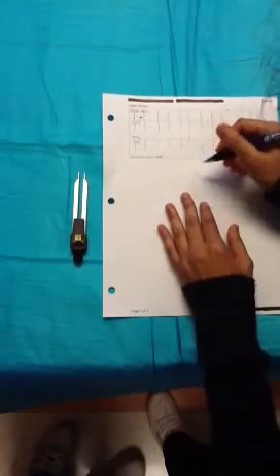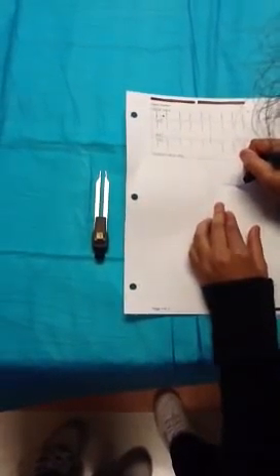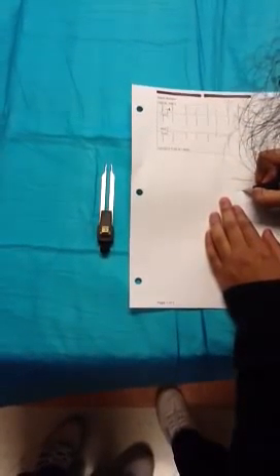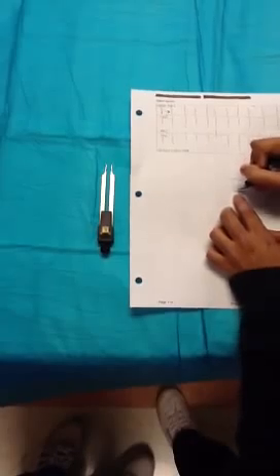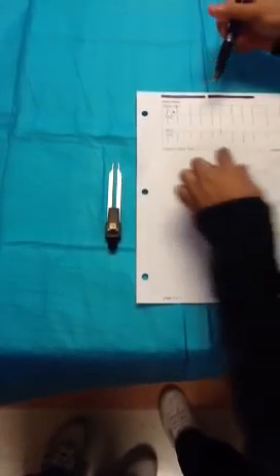If it's an A flutter, the P waves would be like this. For A fib, they're more little shaky. They're like quivering. There's a bunch of quivers and multiple P waves. For this case, it looks more like the atrial fibrillation, which is AFib.